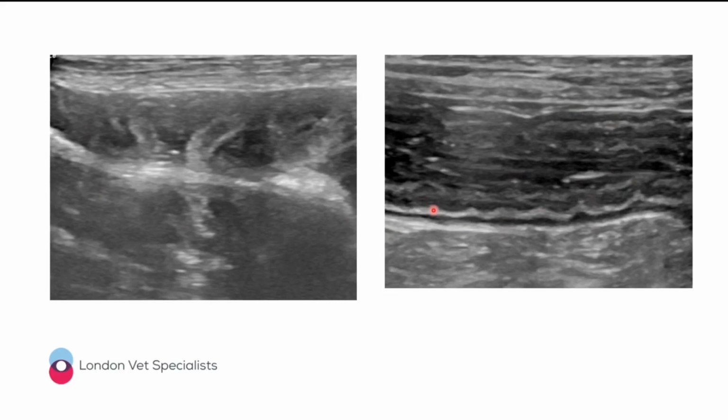This patient that just has corrugated small bowel could potentially just be treated medically. So there's lots of different causes for corrugation. You see it quite often if the bowel is inflamed in patients that have gastroenteritis. There are a few other things that can cause it, like ischemia, for example, but usually it's inflammation. You'll see it in patients that have a really nasty gastroenteritis. The bowel is really inflamed and really angry, and then it gets a little bit corrugated. These patients you can treat medically.